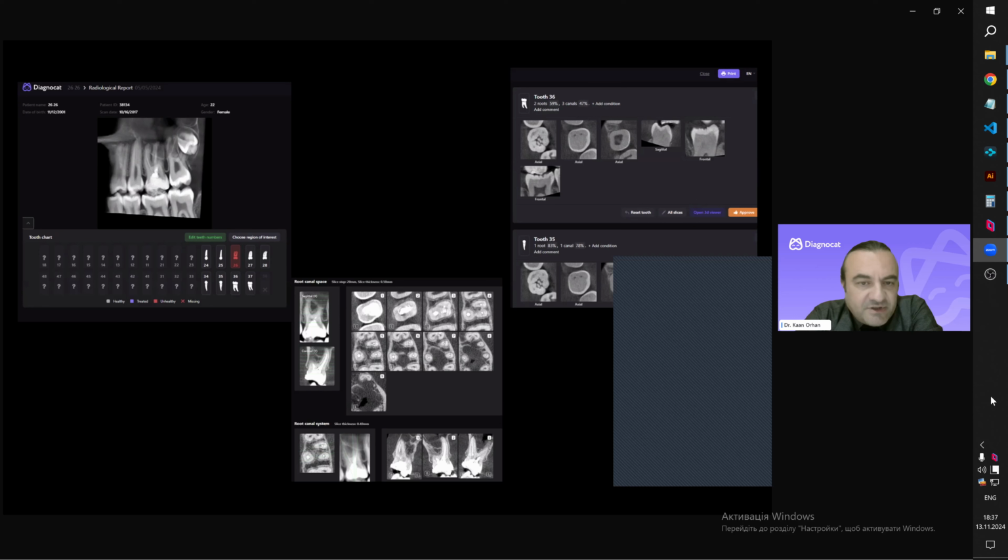All right. Here's another example. In this example, we have root canal treatment, and we can see if the root canal treatment is adequately filled or not, or whether any root canal anatomy was missed in the treatment of the teeth. As I mentioned, the patients can come to you and say that they have pain and so on. And right now we have a decision system to follow all this.